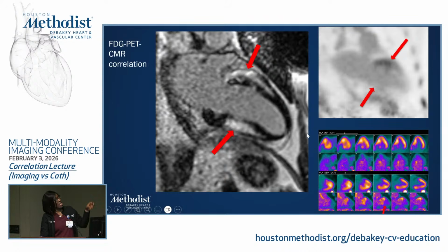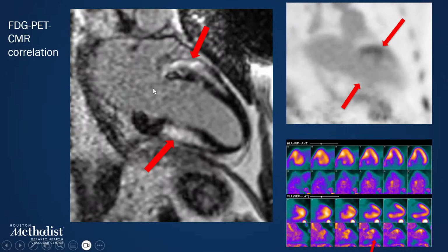So then putting together his MRI images and FDG PET images obtained 26 hours apart, we can see that his MRI images show this dense gadolinium enhancement in the anterior and inferior wall, and his FDG PET images show focal FDG uptake in the anterior wall, largely the subepicardium, which completely mirrors in shape and extent what we see on the cardiac MRI late gadolinium enhancement.